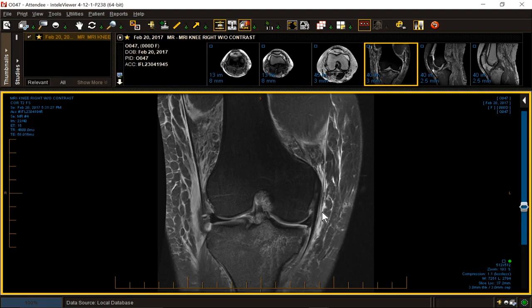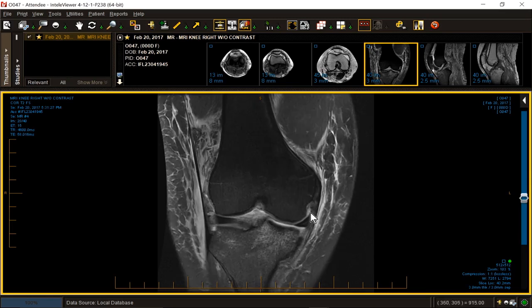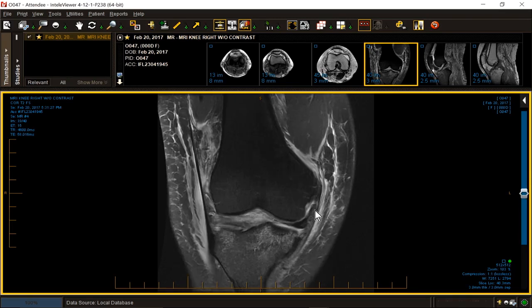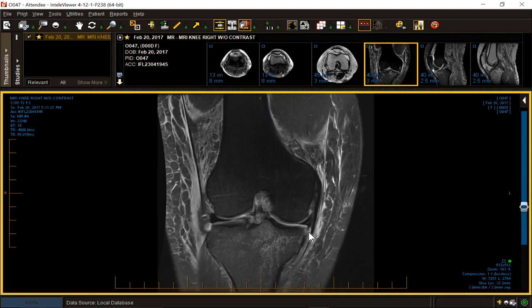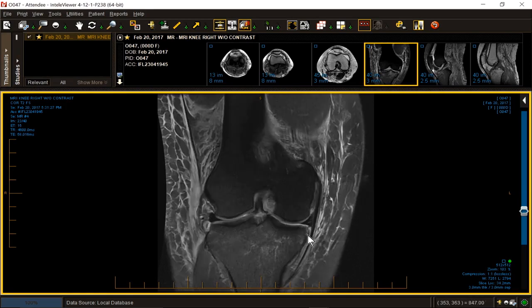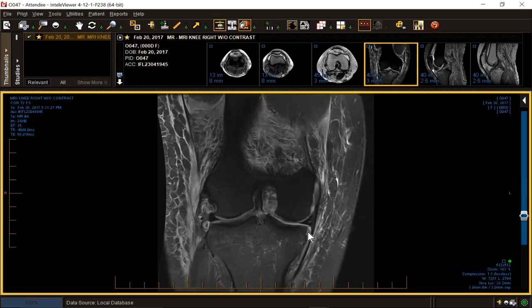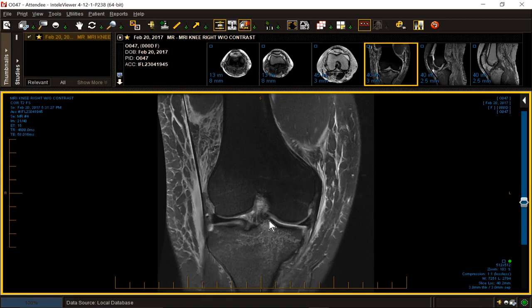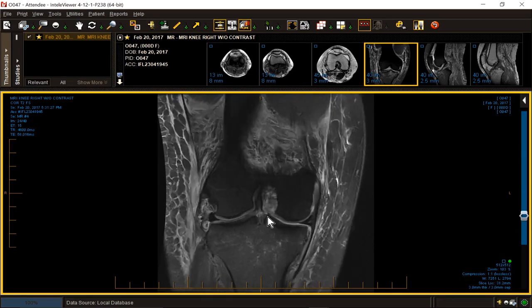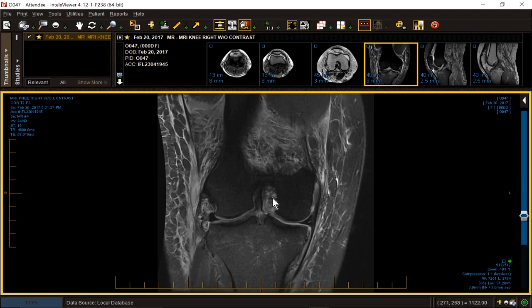Let's look at our MCL, since we're in the neighborhood. Superficially, swollen. Tibial collateral, swollen. Meniscofemoral attachment, present, but swollen. Meniscotibial attachment, coronary ligament, present, a little wavy. ACL, nice and straight. ACL distal attachment, straight. Swollen, but straight. PCL, it's vanishing.